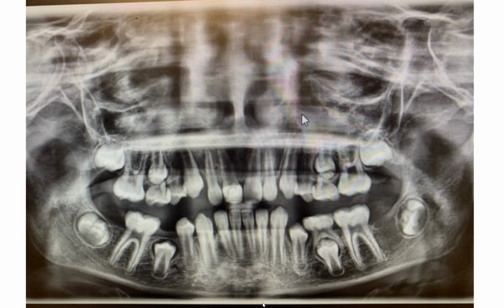As I shared with you earlier, this patient is about 10 years old, and with that we're seeing erupted first molar in all quadrants, and the second molar is still in development. However, one thing you might have noticed is the distance between the second molar and the first molar over on this side, patient's left side, is significantly wider than the other side. So you may be wondering what's going on here.